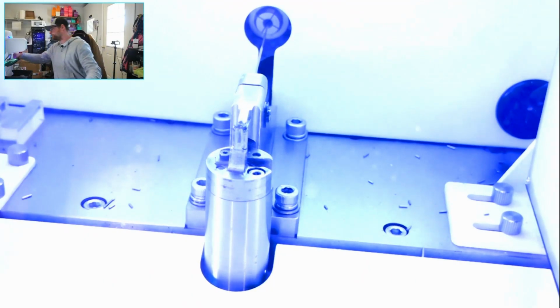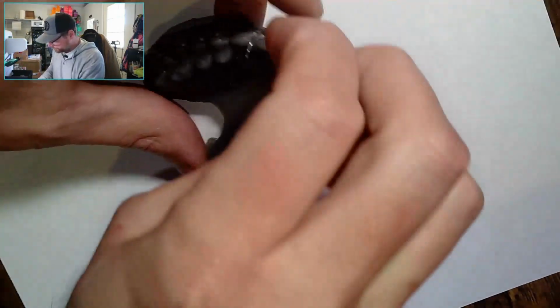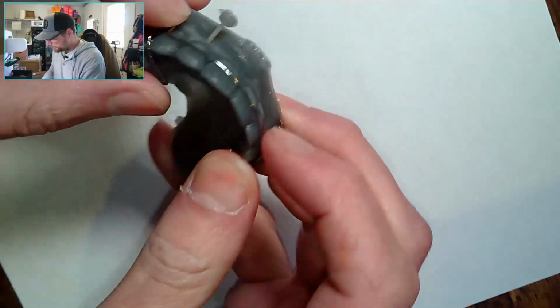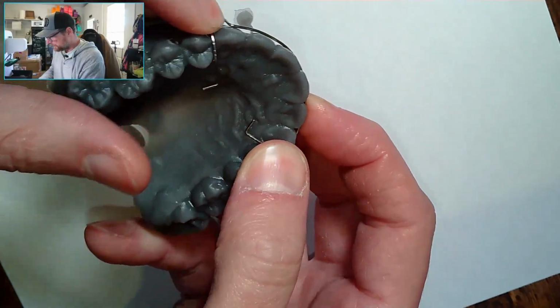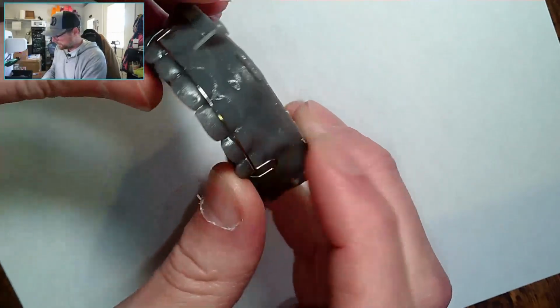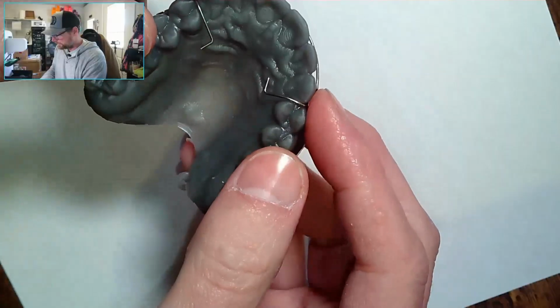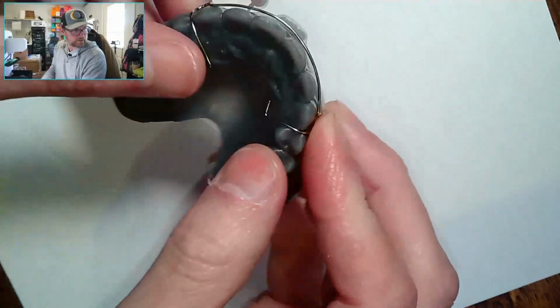Okay. Here we go. So I can see a little bit more calibration. Again, I'm using JBC wire and we're calibrating it, so it needs a little bit more there. But otherwise, that looks just like it did in the computer. It's a little flared up there, but I can live with that because I got to tuck that in anyway.